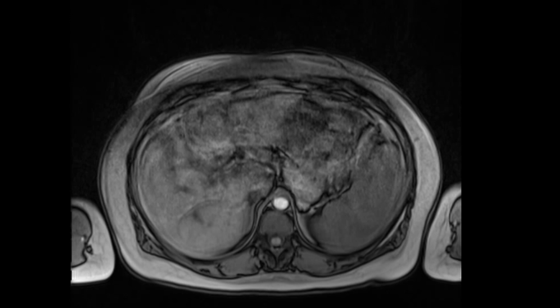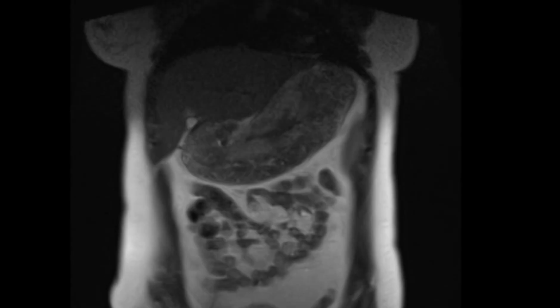First of all, you should look at the patient. Most of the patients will be a little bit psychologically, let's say, inappropriate in some way. Most of them are females, not all, most. Most of them will have bad hair because they eat it. They pluck it out. You'll see the hair is ugly looking. And if you see on the coronal here, this would be very typical.